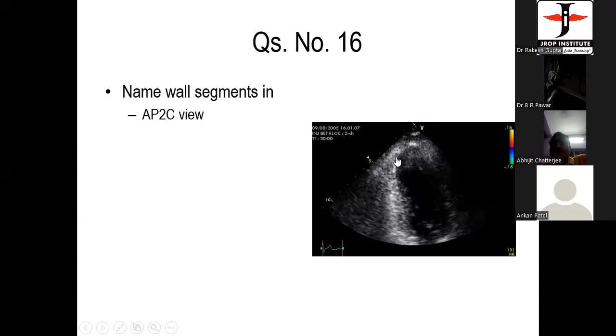What structure do you see in the mid inferior? What do you see there? There is some remarkable structure. Trabeculation. No, there's something more important than that. It will come and go during systole and diastole. That is the inferior papillary muscle. Okay.